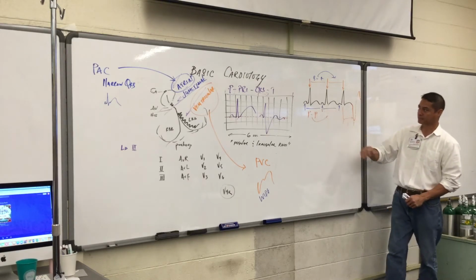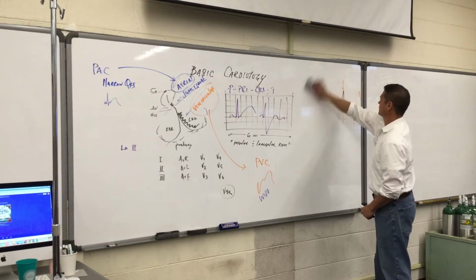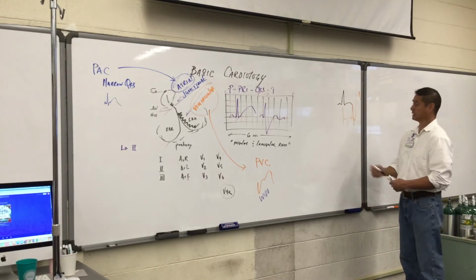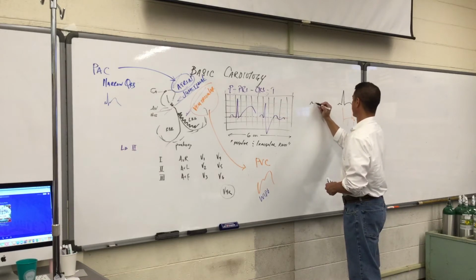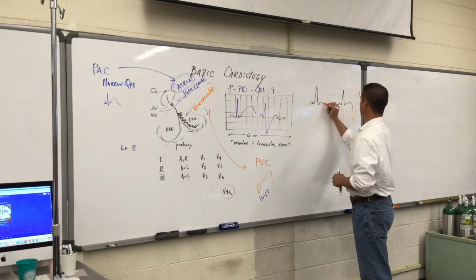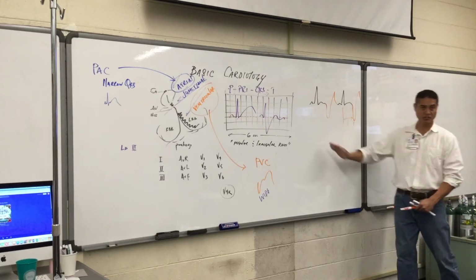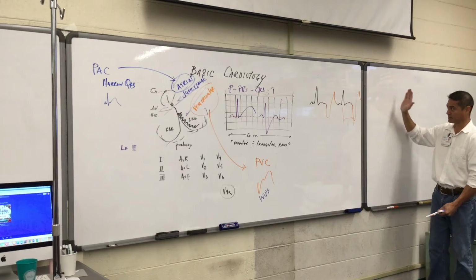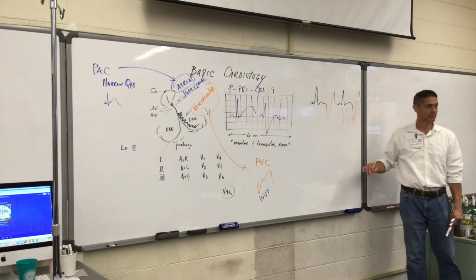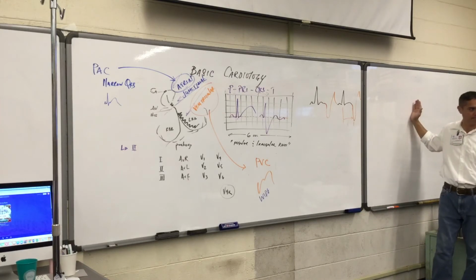So if we think about it, if this is occurring over and over, or even if this was your 3-second strip, and we then put 2 more on this side, what's the overall heart rate here? 1, 2, 3, 4. We put 1, 2, 3, 4.